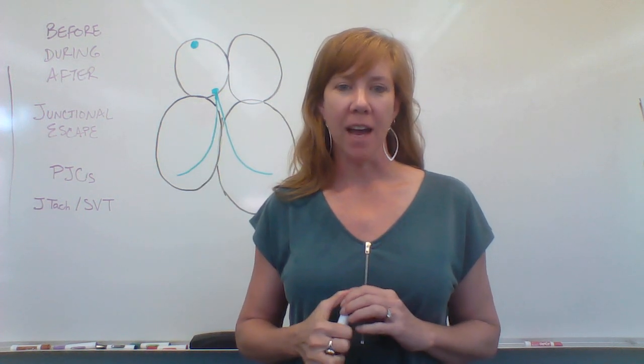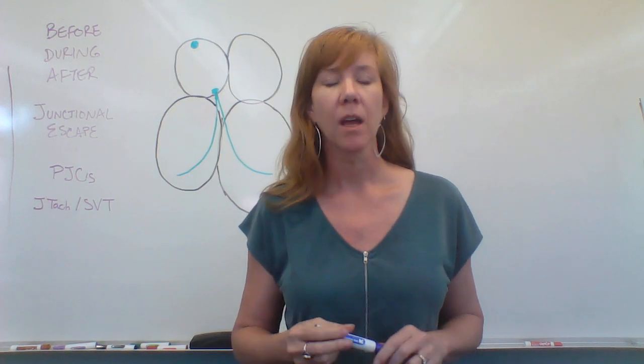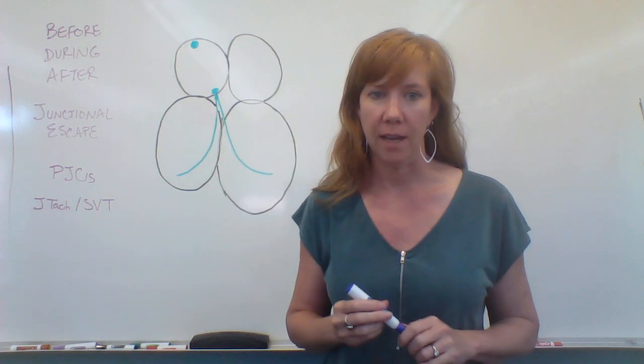Hi guys, I'm back, and this time we're going to talk about junctional rhythms. There aren't very many junctional rhythms, so this one is a little bit shorter. The main thing you need to know about junctional rhythms is how to recognize what a junctional beat looks like.